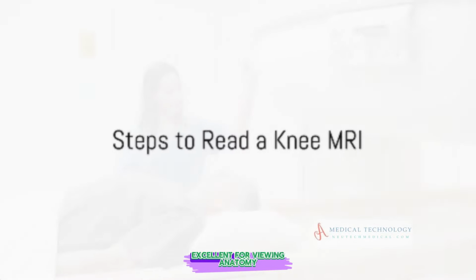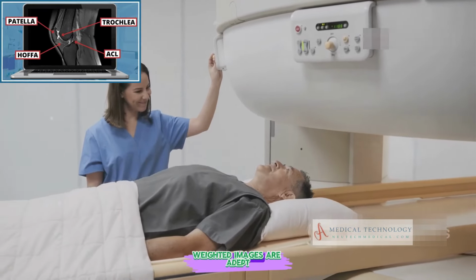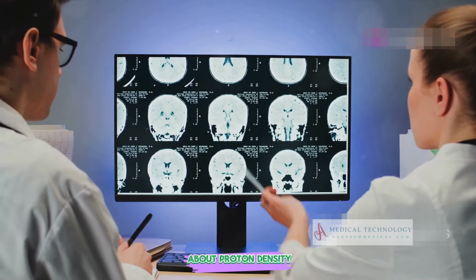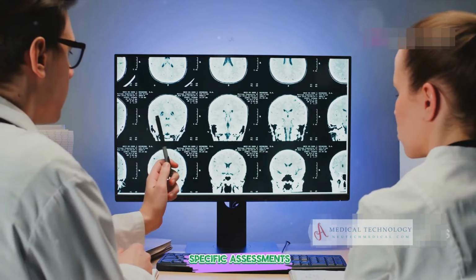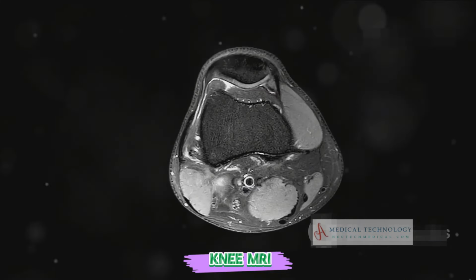When it comes to sequences, T1-weighted images are excellent for viewing anatomy and bone marrow details. T2-weighted images are adept at detecting fluid and inflammation. Don't forget about proton density and fat-suppressed sequences, which are crucial in specific assessments. Now, dive into the steps to read a knee MRI.